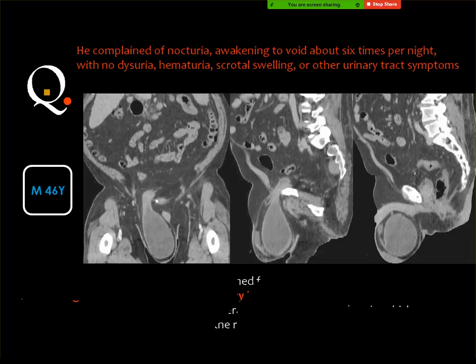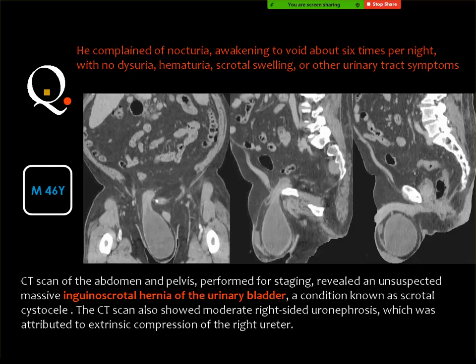Cystocele. Yes, and this is herniation of the bladder in the scrotum, what's known as cystocele. This is right, and this is the cause of the patient's complaint.